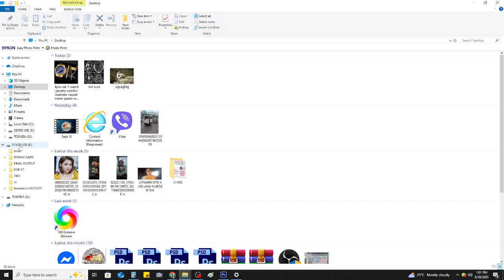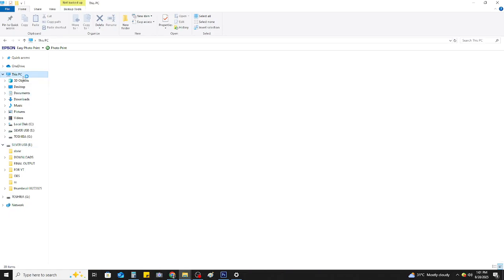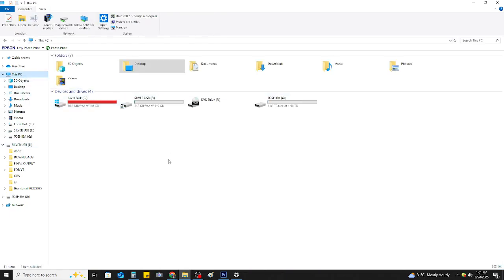Once your DVD has loaded, you'll want to locate your MRI files. On a Windows machine, open File Explorer. If you're on a Mac, use Finder. Navigate your way to the folder corresponding to your DVD drive. Here, you should find a folder with a name like DICOM, images, or perhaps data.